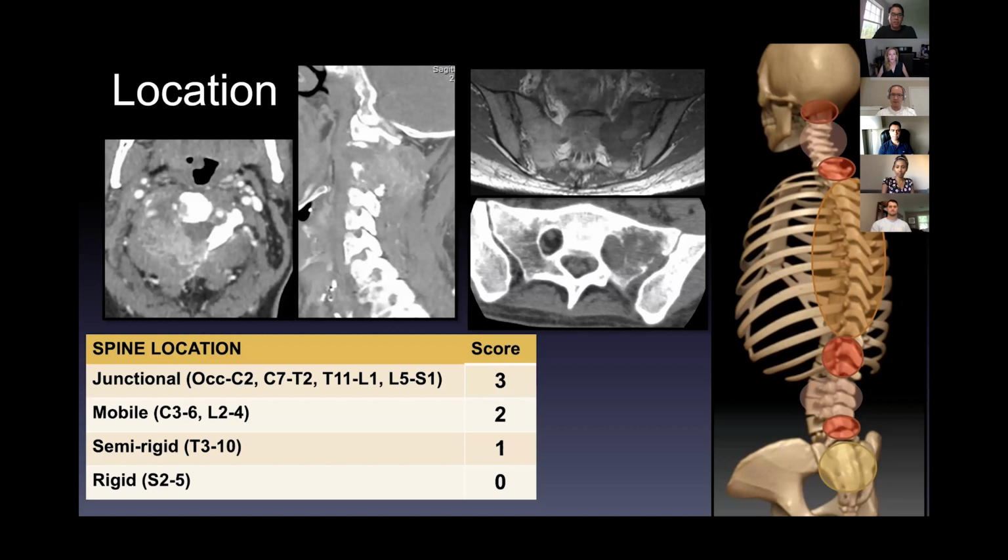I mean, this is clearly a radio-resistant tumor, renal cell, hypervascular. It's kind of upper cervical spine, but it does involve C2, C3 there. Pretty diffuse epidural disease. And this patient has mechanical pain. Any other considerations? Anyone thinking here of surgery versus radiation?